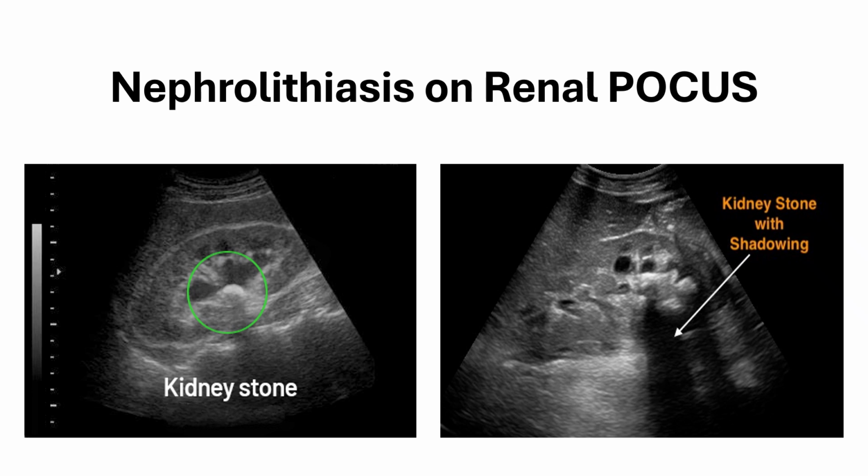On this right image, you see a renal stone given the dense shadowing artifact. Please take a moment to review this image.